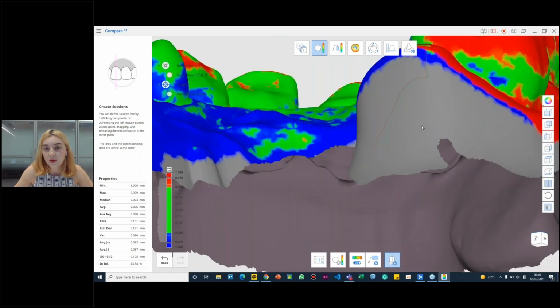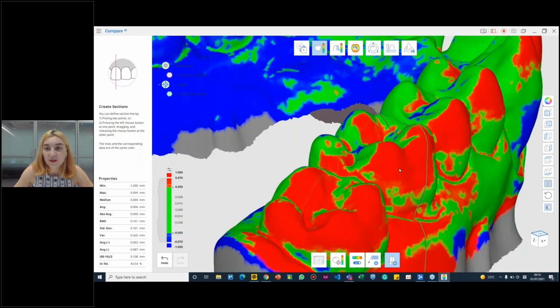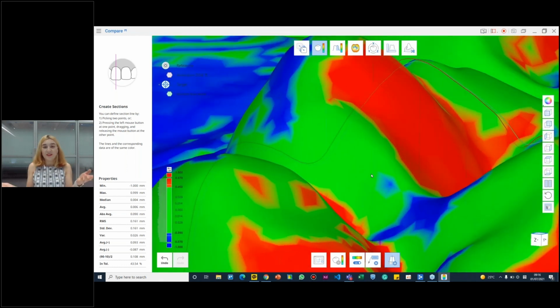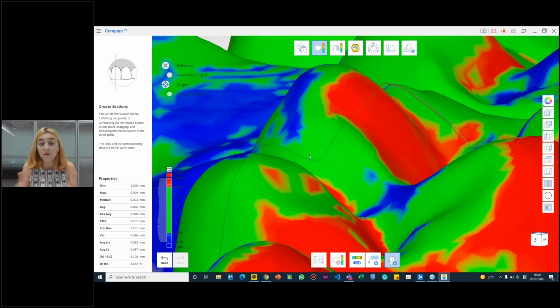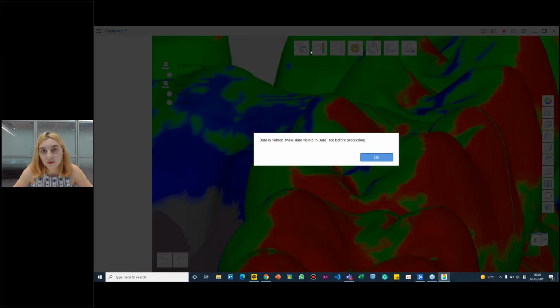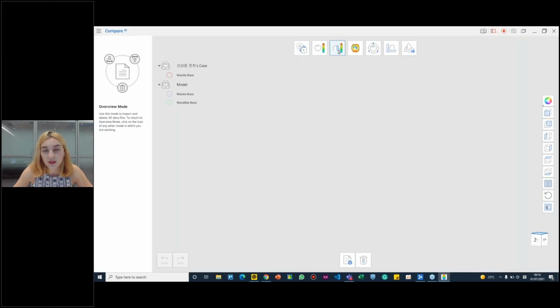So this is the very basic way of how you work with Metacompare. As the title of the app suggests, you compare one set of data to another set of data, and you can work with as many data files as you want. And that's basically it from my basic introduction of the app. And let me just go through all other stages that we have here in Metacompare.